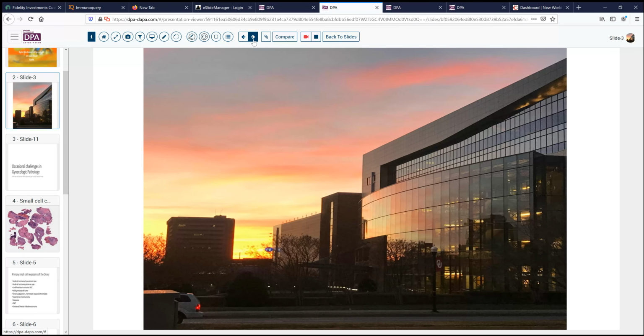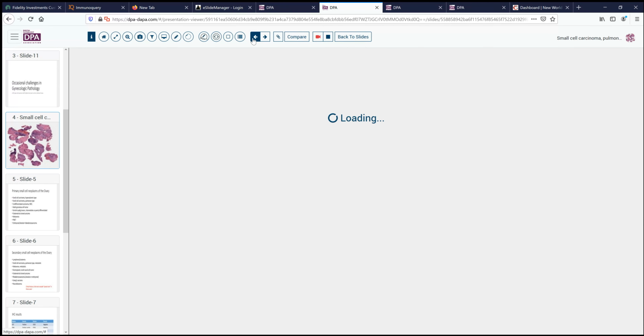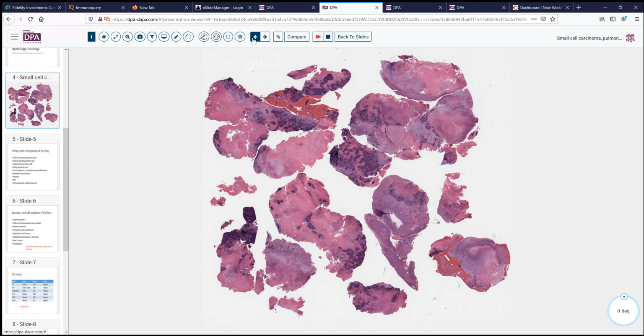Our case today comes from one of the very challenging and interesting cases presented recently, that of a 42-year-old woman who presented with abdominal pain and adnexal mass and what appeared to be potentially disseminated tumor. On exploration, she was found to have rather socked in tissues, and so only fragments and biopsies were obtainable at the time of laparoscopic exploration. Of course, due to the advanced stage, consideration of resection was not feasible for her.